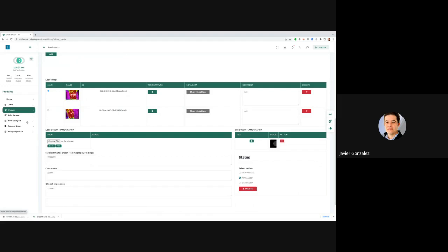Okay. So if you can make me a list of things that might be improvements for the app as it currently is, that would be great. Absolutely. We can start working on that. So we'll just mess around with it here a little bit and then figure that out.